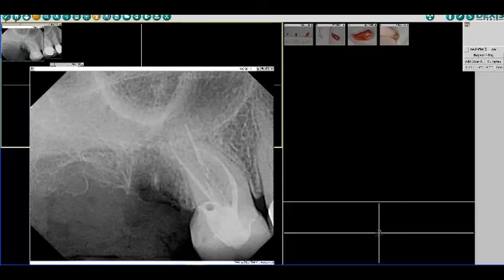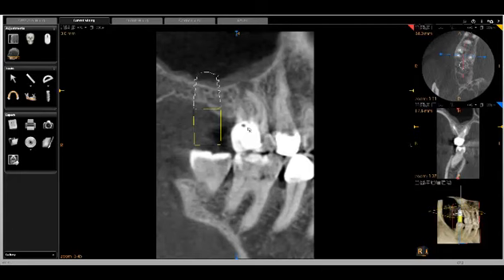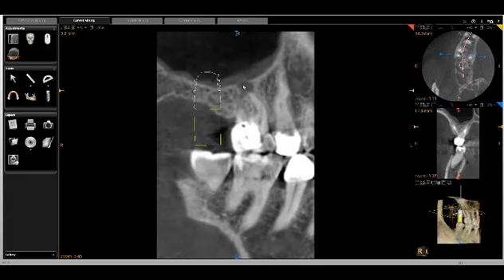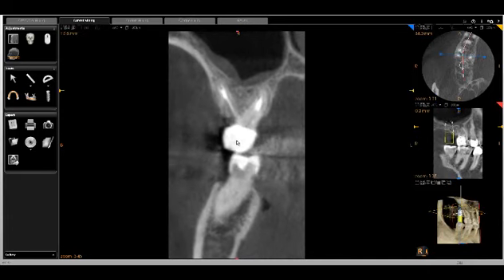Everything looks within normal. The cone beam image shows pretty clearly here how not only was a second mesiobuccal canal missed, but there is communication into the sinus floor from this tooth that was not instrumented completely.